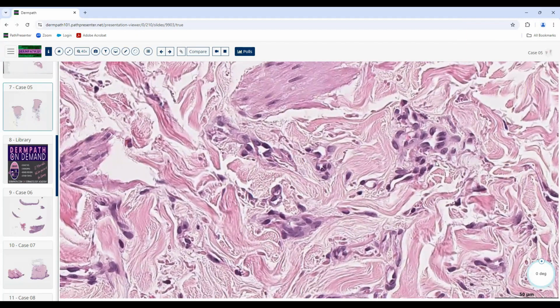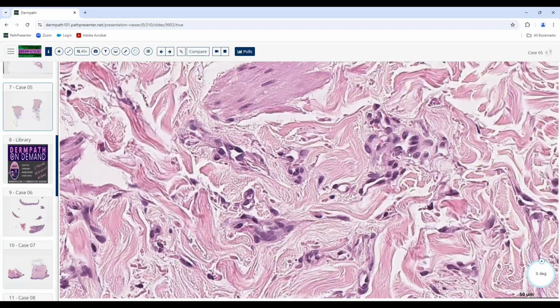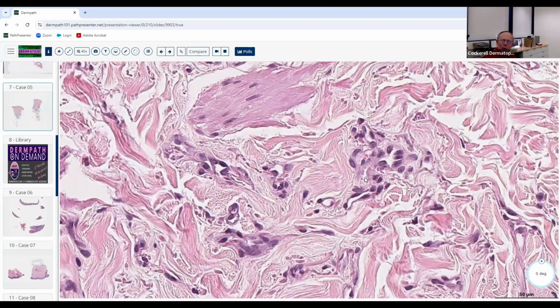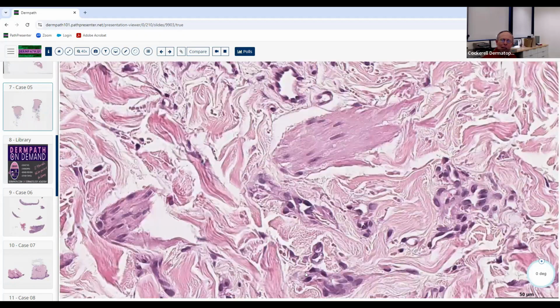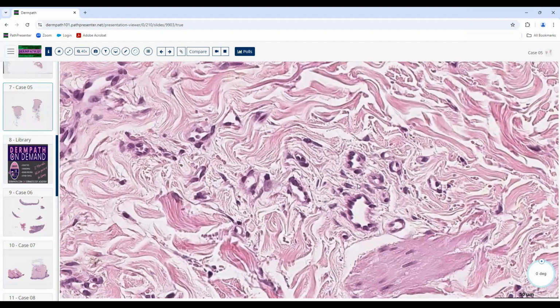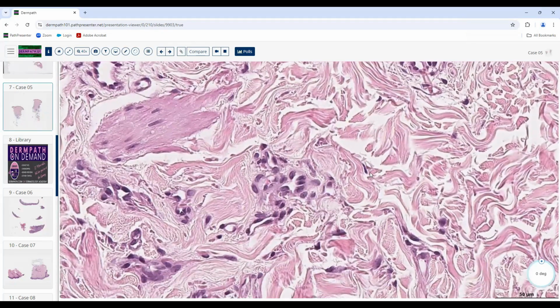In this lesion, there are. I don't see any encompassed collagen or dissected collagen bundles. Okay. Tell me what you mean by that specifically. That can be an important criterion. What do you mean by that? For dissected, I would look for a collagen bundle in which I see a vascular channel running perpendicular to it, cutting it in half or into two parts.